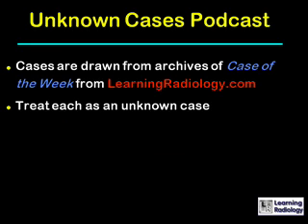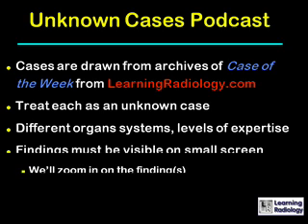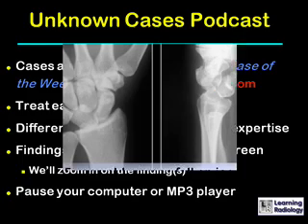Treat each case as an unknown. They'll involve different organ systems and different levels of expertise. Since the findings have to be visible on the small screen, we'll zoom in on the findings. And don't forget to pause your computer or MP3 player after we show you the case and before we tell you the answer. So this is the first case.